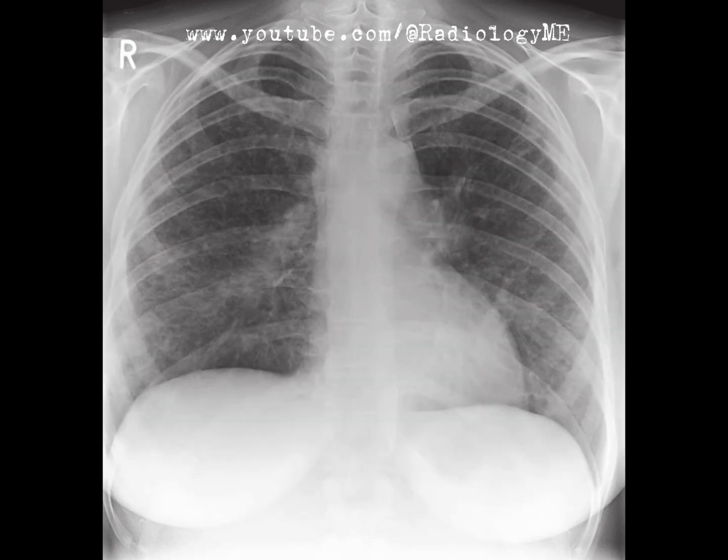So let's summarize. In a case like this, where we have bilateral hilar enlargement along with interstitial lung changes and mediastinal lymphadenopathy, one diagnosis that rises to the top is sarcoidosis. Sarcoidosis is a multisystem granulomatous disorder, and the findings here, particularly the nodular pattern of interstitial disease, really support that. It's common in young women like our patient here, and the Garland triad, which involves the bilateral hilar, paratracheal, and right paratracheal lymphadenopathy, is another classic feature.